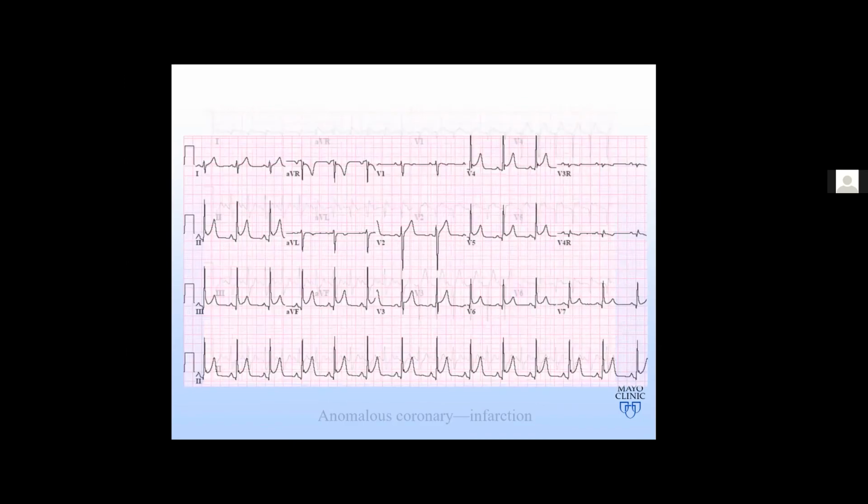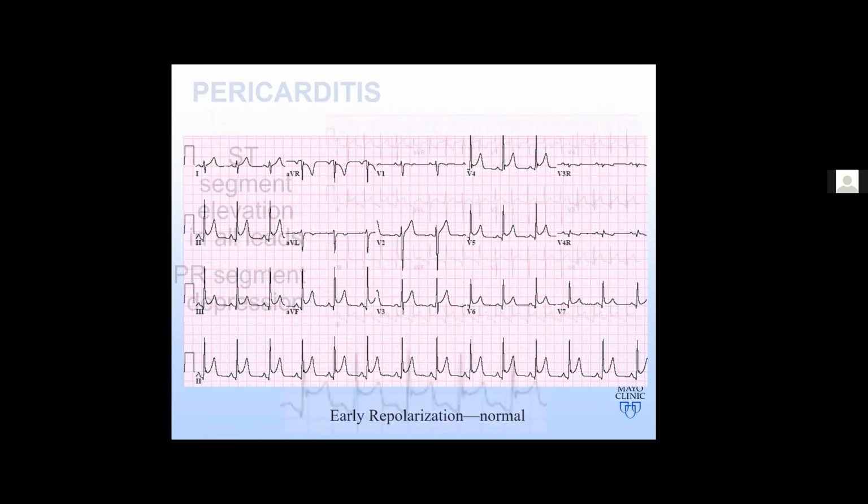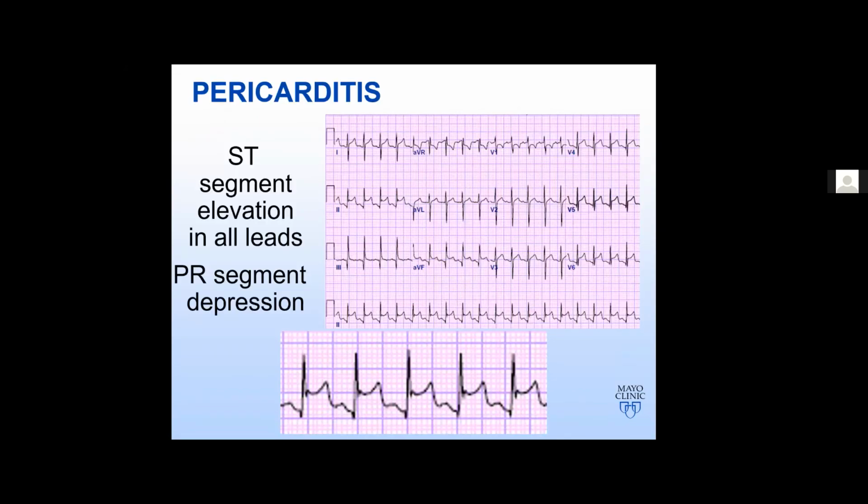an urgent situation. If you look at patients who have pericarditis, you can see ECG findings, but you should not use this as the final test, because if you have pericarditis, you only have about a 50% chance of having these ECG findings. So what you'll notice is diffuse ST segment elevation, but the kicker in pericarditis, and one of the most important things, is you'll also see this PR segment depression, okay? We don't exactly understand why this happens, but when you see this PR segment depression and diffuse ST segment elevation, you should definitely think pericarditis, and you should get an echocardiogram.